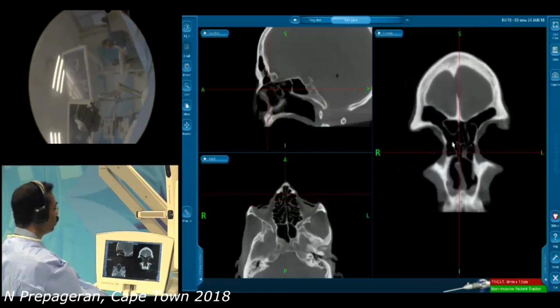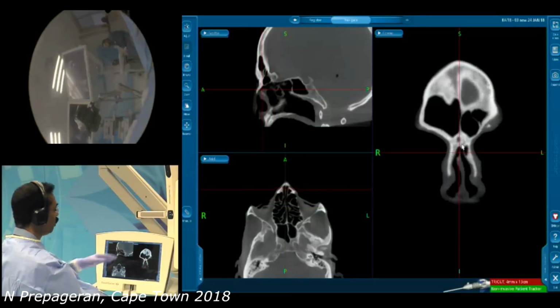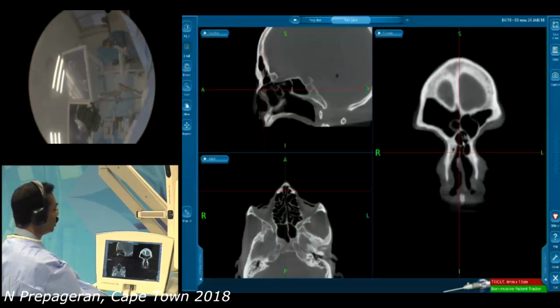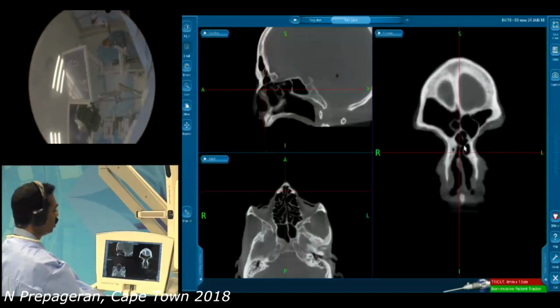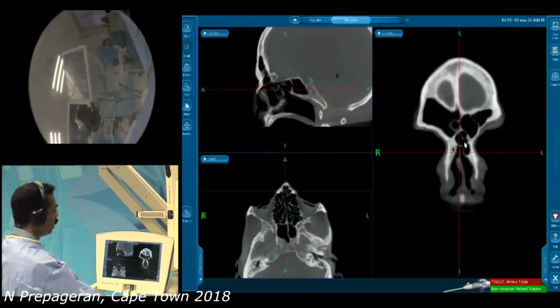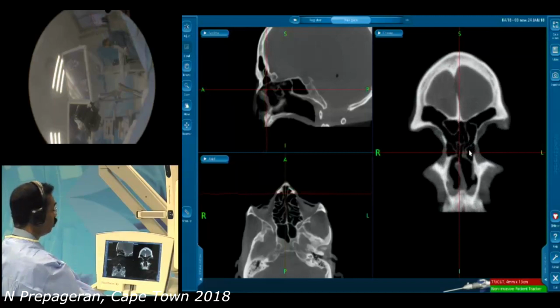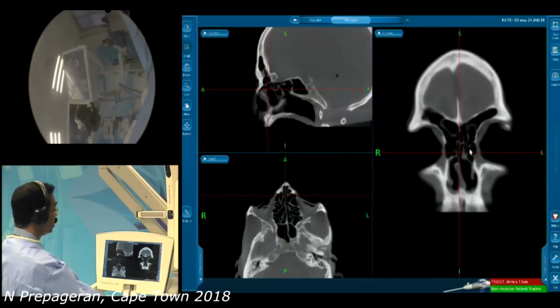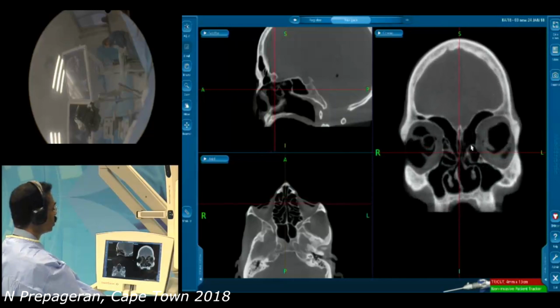So usually we have a nice frontal beak. This is the frontal beak. So whenever you see the frontal beak missing, like this is a pneumatization of the frontal beak here, that means we are already entering into the ethmoids. So this is the landmark. We know from which level the frontal becomes ethmoid. When the frontal beak starts disappearing and you see air cells, agger nasi, you know now you're going into the ethmoid sinuses.